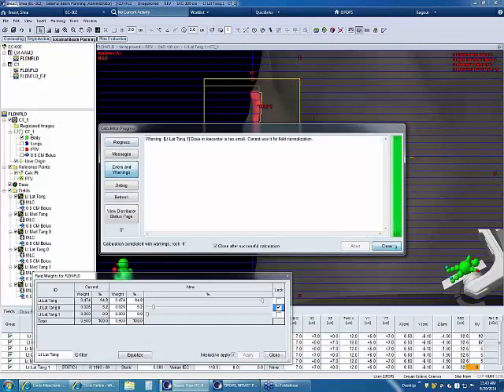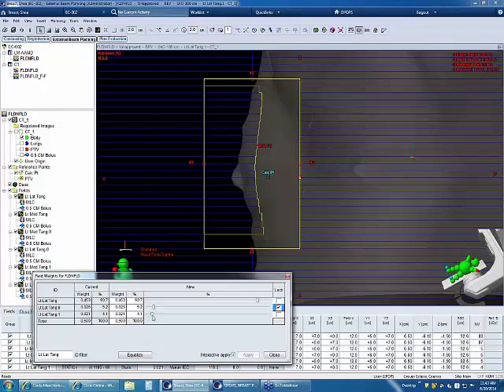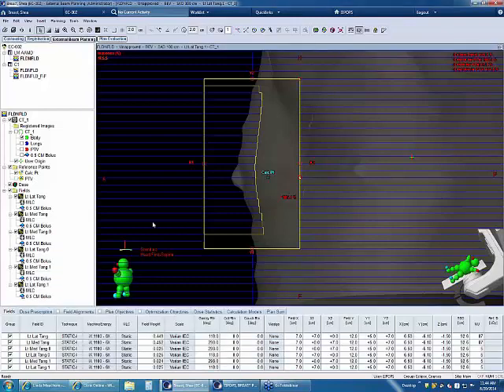And I'll close this, okay? And again, I'm going to pull weight off that parent field. And a little bit more. The reason I don't want to get too aggressive is if I had something like 10 monitor units, that would be too big of a jump down in dose. And then I probably would be having a lot of tissue pulled away from the chest wall. I mean, a lot of dose pulled away from the chest wall.